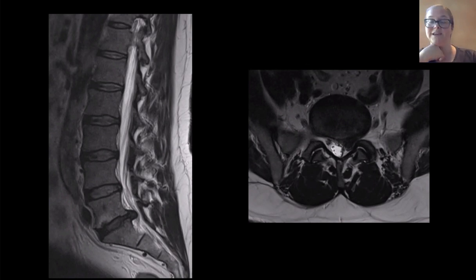You don't have to stay on every lumbar spine. Five lumbar-type vertebral bodies are presumed. You can look back, and I will say, based on the previous CT, there are five lumbar-type vertebral bodies, or there's a transitional block. So first I describe the number, then I look for the alignment. Do we have any listhesis? We know that listhesis can be caused from degenerative change, usually at the facets, or pars defects. Are they present or absent?